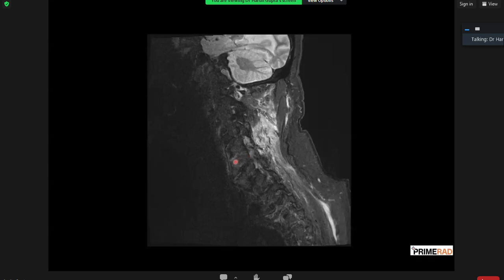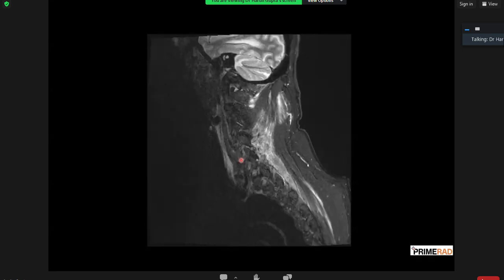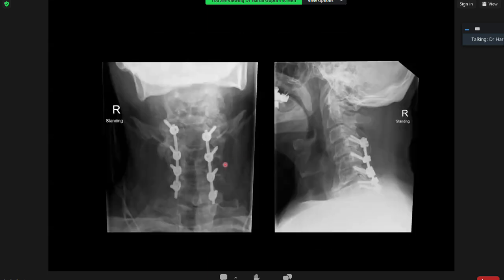So what has happened is the patient has had trauma through the fused spine, and this is unstable, significant injury, and the patient had surgical fusion to repair this, because otherwise the patient will be left with instability and significant consequences.